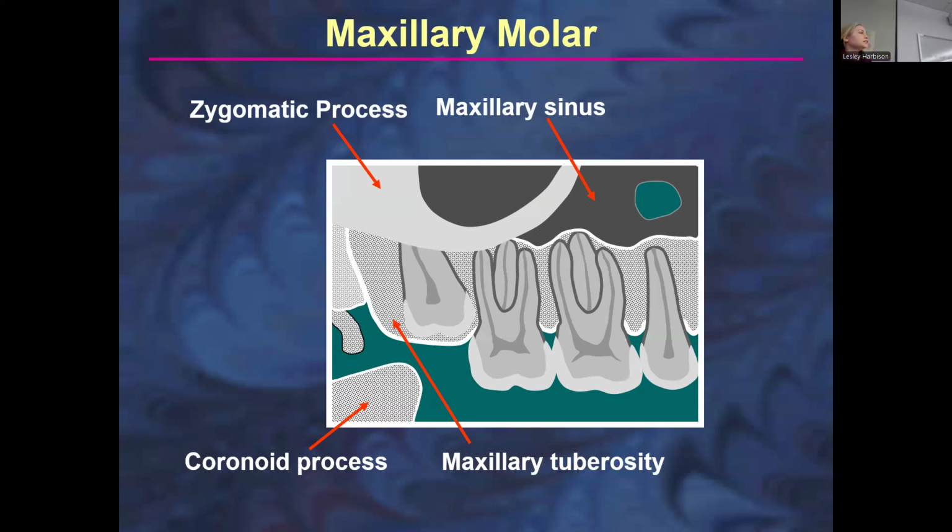Is it visible in all of them? Not all. It really just depends on your angle, but it's the only shot that has the possibility of seeing a mandibular landmark. It depends on your patient's anatomy and the angle that you take the picture, but it happens quite often. It's not a rarity, but it's not in every single picture either.